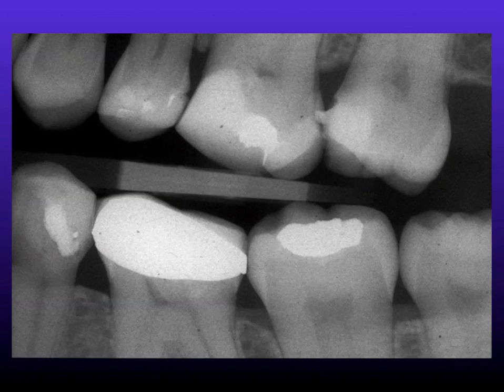This is just to remind you that something which is radiopaque will look white or clear on a radiograph, and radiolucency represents a darker area. It's not uncommon for people to get those mixed up, even at the later stages of the dental course.